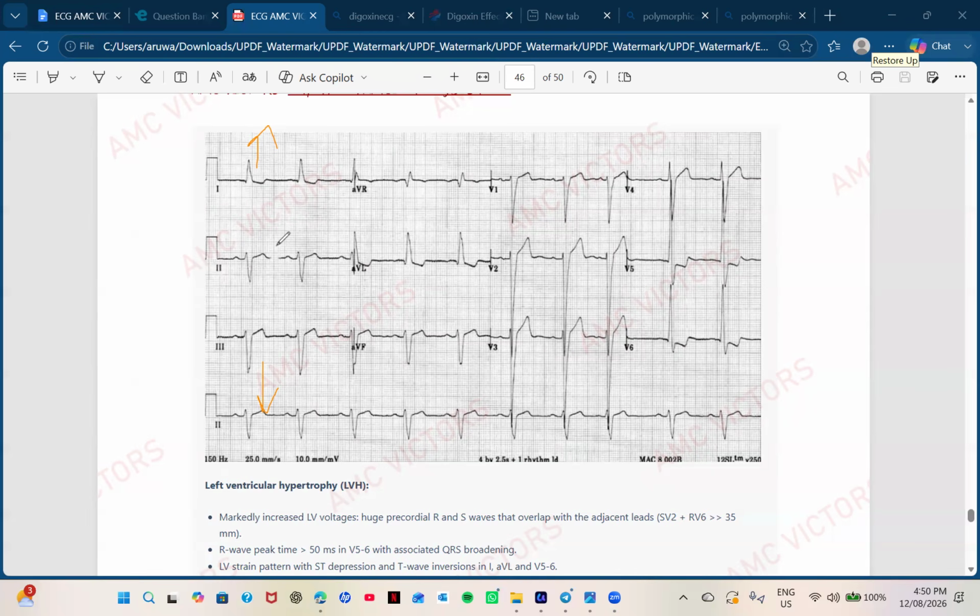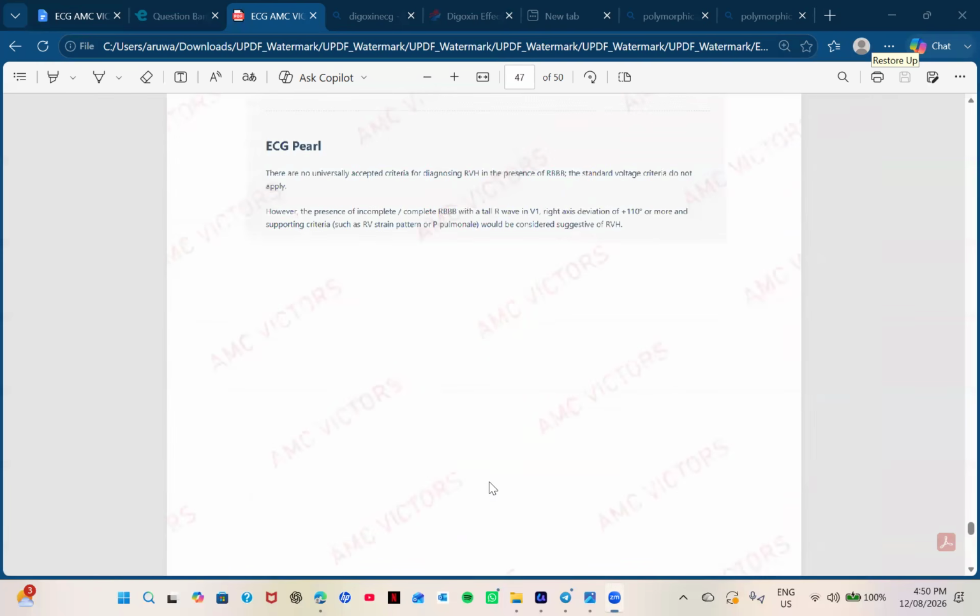Then you can decide if you have any doubt. This is not the proper standard way. This is the simplest way I used to remember. Here's a positive, here's a negative. So here he's going this side and she's going this side. Coming towards, and going away.